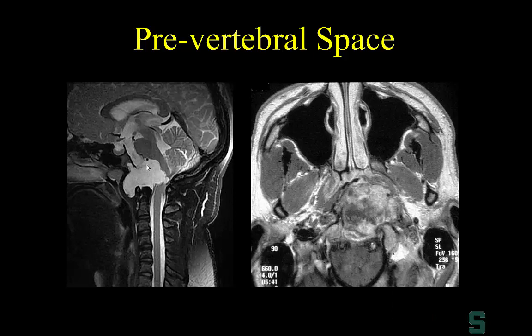Now here is one of those head and neck masses that's kind of unique to the head and neck. So if I tell you there's this aggressive mass that's arising at the top of the vertebral body, located just below the clivus, it enhances with contrast, but on T2 weighted images, it's high signal, indicating that it's a little bit more mucoid containing. Then anybody want to take a guess at what this diagnosis is? Chordoma, exactly right, perfect. So this is one of the unique things.